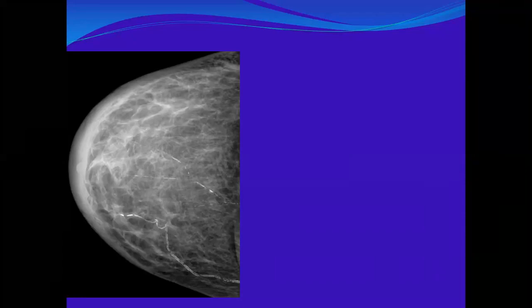For me, this is breast edema. Excellent. So it's breast edema. I'll sort it out, looking for the cause of breast edema.